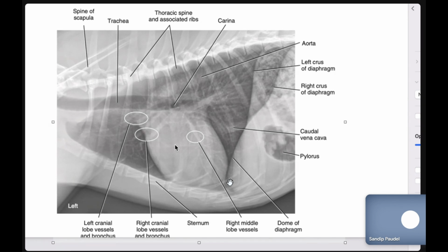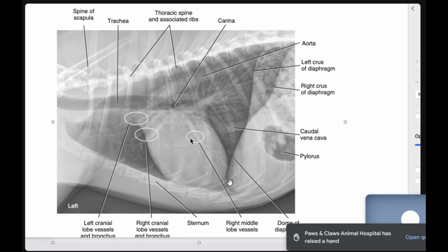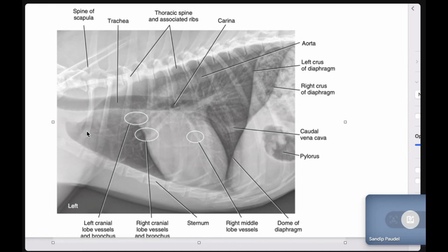So now, if we really need to go in deep, first dorsal comes the artery supply, and the bronchus, and the vein. So we can say A, B and V: artery, bronchus and vein. So this is the normal pattern of the supply that happens in the lung tissue. Once we start understanding this minor structure, it's very easy to understand the pathological condition. I hope it's visible and everyone is able to see.